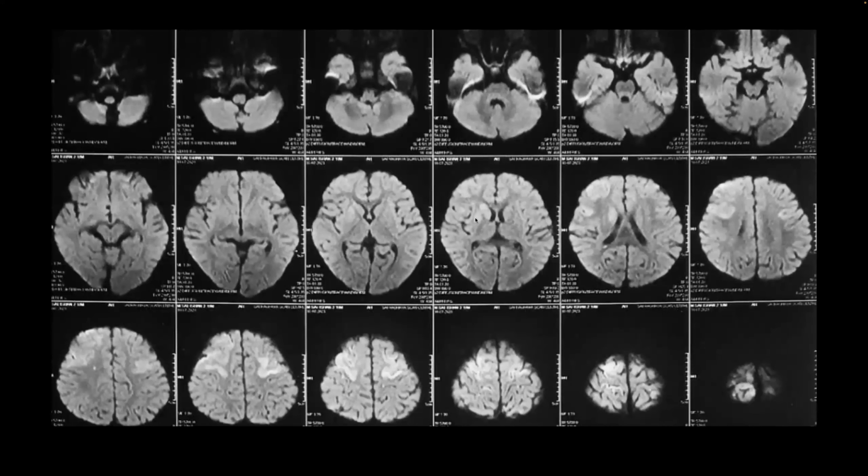Okay, I have only film images. Apologies for slightly pixelated, blurred images. But Anas, at what time period was it done? Was the scan done from the clinical symptomology? So he came to us on day 4. Okay, scan done on day 4 of symptoms. Yes, 7th he had the seizure, and he came to us. Okay. Day 4, day 5.